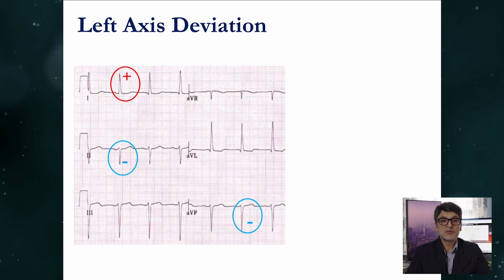In a 70-year-old individual, left axis deviation would almost be considered normal. So certainly in a 70-year-old, I wouldn't label this as an abnormality. Conversely, in a 25-year-old, left axis deviation is an abnormal finding and merits further careful review and probably specialist review. In general, as you get older, your axis, unlike your political affiliations, shifts towards the left. And when you're younger, your axis is more rightwards, again opposite to your typical political affiliations.